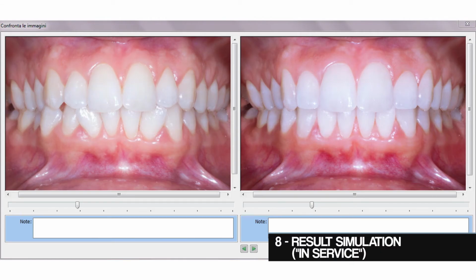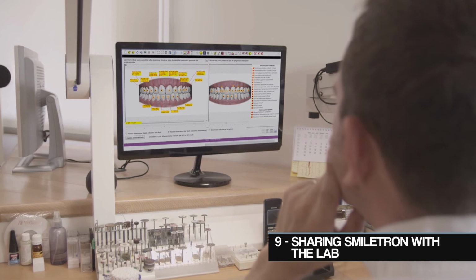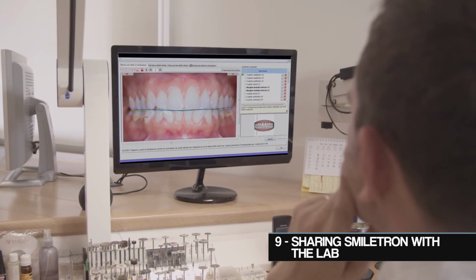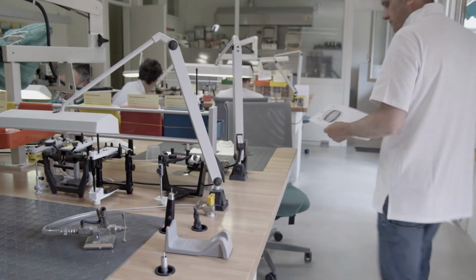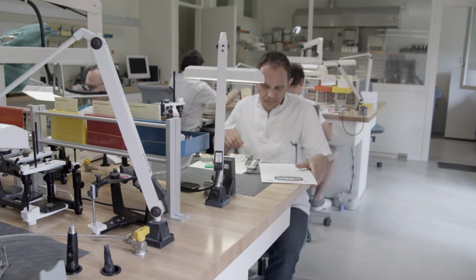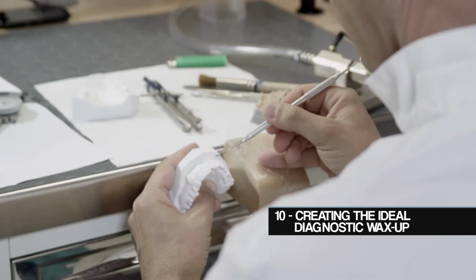Once the patient approves the project described by the specialist using the realistic photo simulation, giving the lab the go-ahead is just a click away. The lab will have real-time computer access to the patient's clinical file and will visualize everything it needs to produce the diagnostic wax-up, including 3D files importable onto the lab's model builder software.